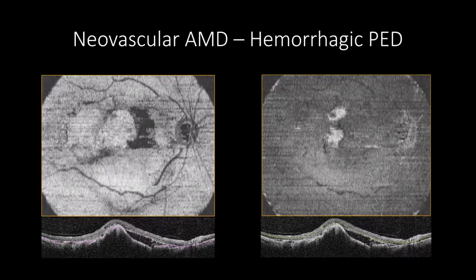In hemorrhagic pigment epithelial detachment, the RPE slab will show hyperreflective mass elevation with defined borders and might be associated with hyporeflective pockets due to subretinal fluids if present. The inner plexiform inner nuclear layer slab might show a smaller hyperreflective mass, depending on PED height and OCT segmentation. This slab might show cystic changes if the PED is combined with intraretinal cystic changes.